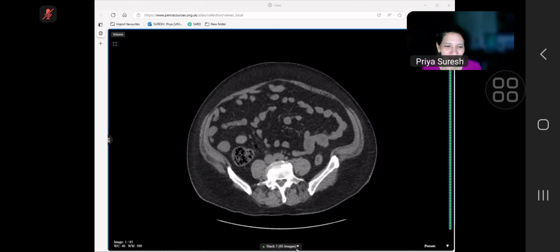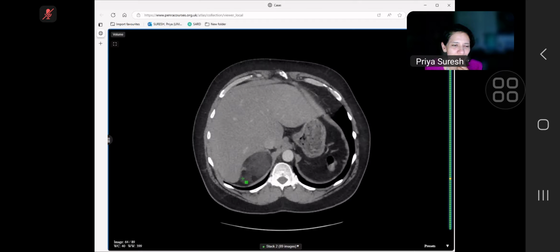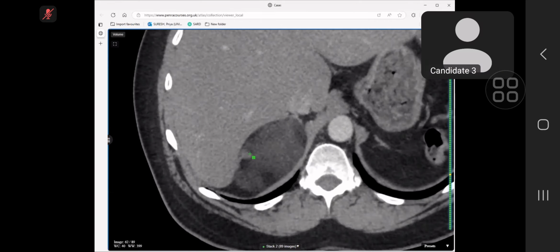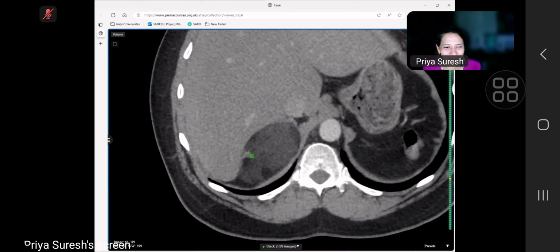you got it, and then you said about the post contrast. So let me just show you the post contrast. If you see, that's why I was going up and down for you to look at it. It's just a blood vessel. Okay. Can you see? That's why I went on. I did that a few times to show you.